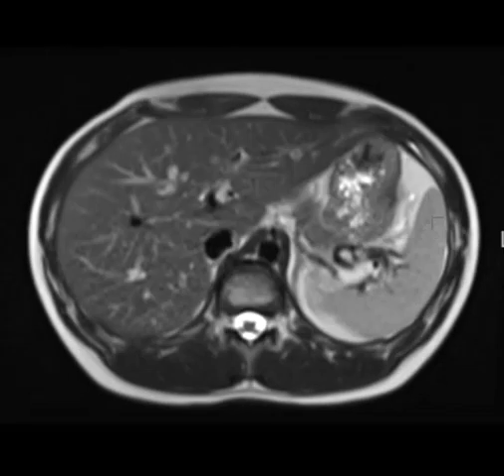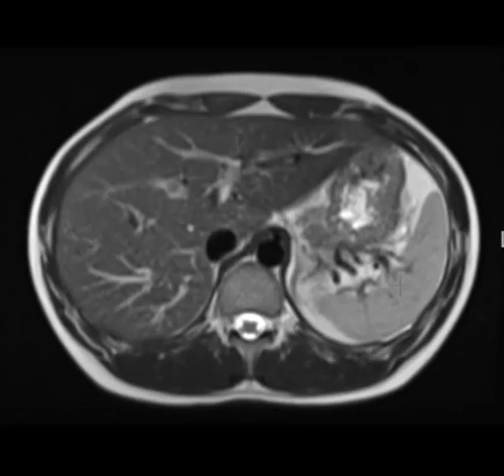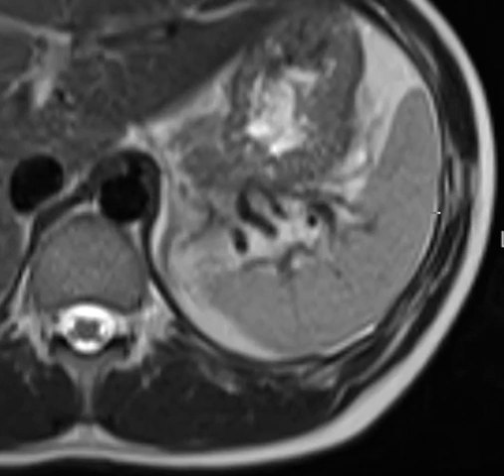Is there a mass in there? Is it a cyst, solid lesion? Is it a nice uniform signal? And we also look at the blood vessels going into it. So again, this is the spleen. Let me zoom down up here.